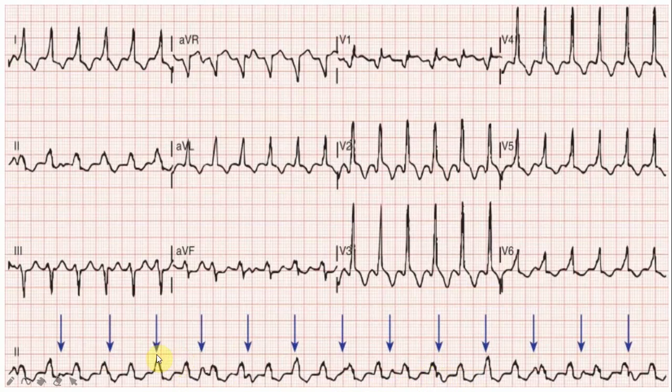If you carefully look at it, the P waves are coming at regular intervals, but there is no relationship between the P wave and the QRS complex, and that can be better demonstrated by the animation that I have made for you in the previous slide.